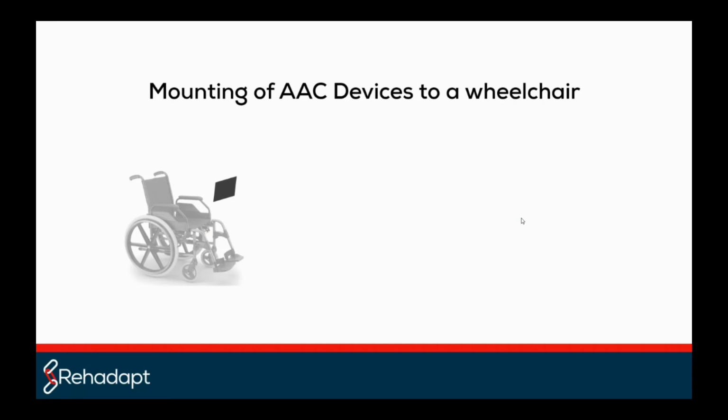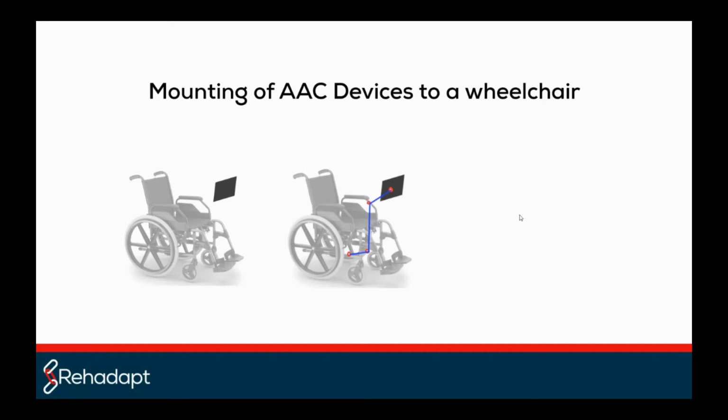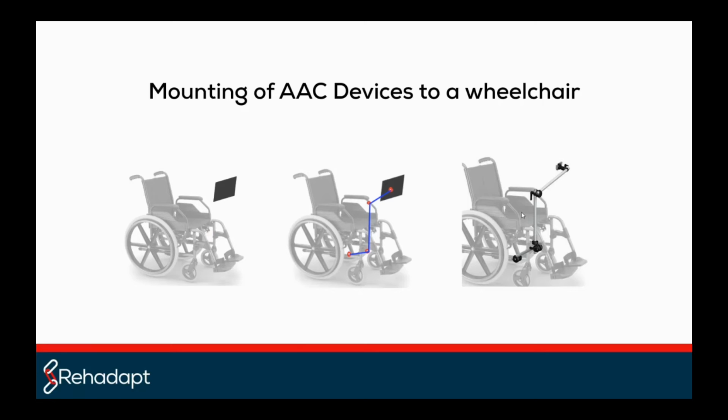because when we are mounting AAC devices or tablet devices to a wheelchair, we often have the same situation or the same job to do. We see our wheelchair, we see the customer that is located in the wheelchair, and we have the tablet system that needs to be positioned on a position where the customer can access it good enough. And in between these two things, between the wheelchair and the tablet, there is always a gap. And this gap can be filled with different kind of mounting components to install the communication system there in the best possible way. And that's the same with smartphones and tablet systems.